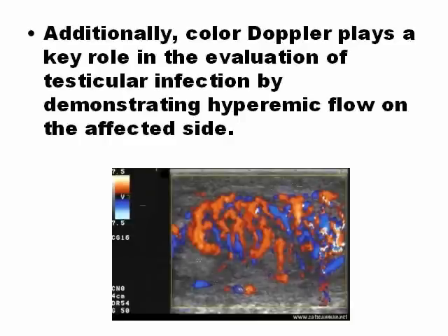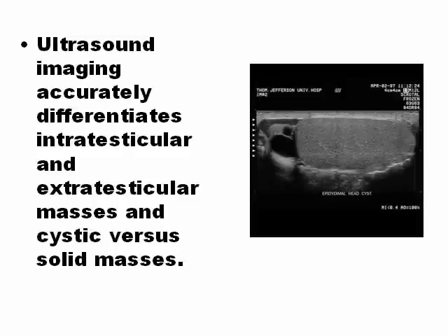If you have a suspicion of infection or cancer, color Doppler needs to be performed. Also, with ultrasound, you can differentiate if the diseases are testicular or extratesticular.